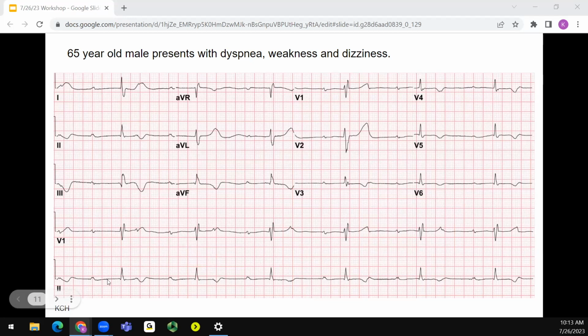So what I think here is there's a P wave here, and then there's another hidden P wave in the T wave. So it probably can't be sinus. Also very slow. And these P waves all march out. So it could be either third degree or second degree. I agree, it's probably third degree, with a widened QRS too. The PR intervals look pretty consistent, but if you get your calipers out, they're not.